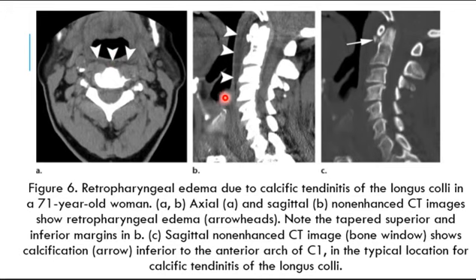How do we differentiate it? It has tapering ends, and it extends to both sides bilaterally, and above and downwards it has a tapering end. Look in the next image, it's tapering downwards. So it's just lentiform, like a lentiform shape. It's extending above and downwards, and it has tapering ends.